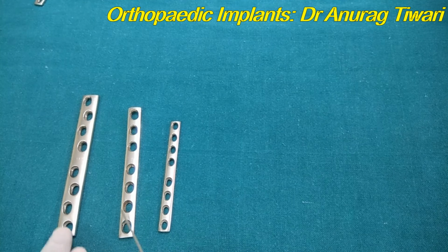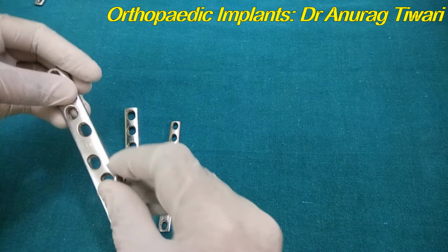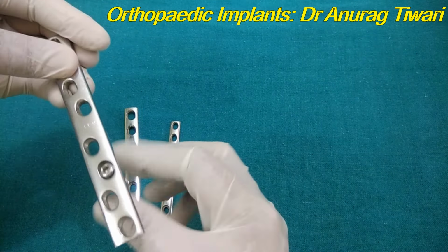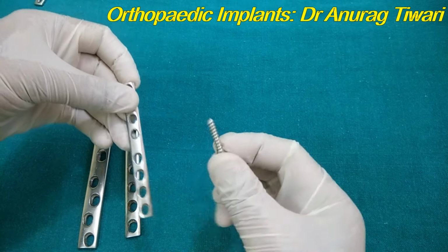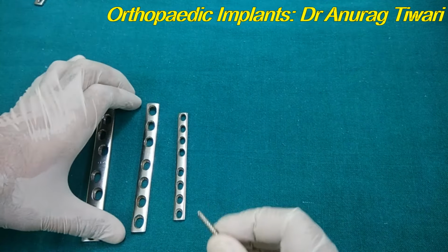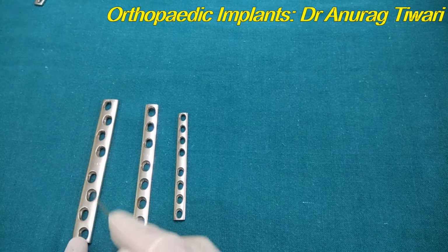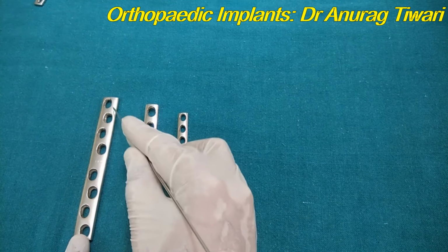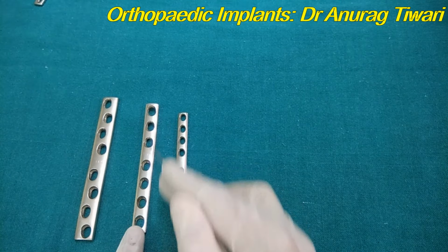These two plates will have the 4.5 mm screws in their holes. You can see that the 4.5 mm screw will get fixed to it, whereas this is the 3.5 mm plate, and the screw will not go through this because this screw is 4.5 mm in size. How to identify the DCP: the broad and narrow are identified based upon the orientation of the screw holes. You can see that this has a zigzag pattern, that is the broad DCP, whereas this has a straight one.